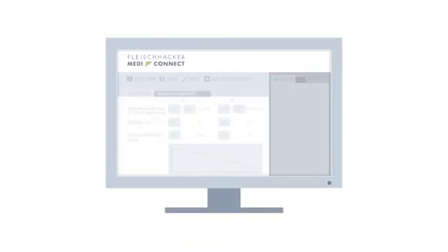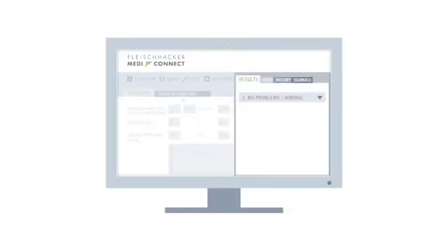In the toolbar, users will find common options for processing the data: confirm, save, or edit. Results from the previous follow-up are displayed in green. Parameters can be graphed over time. After saving, a text summarizing the examination results will appear in the Results tab of the sidebar.